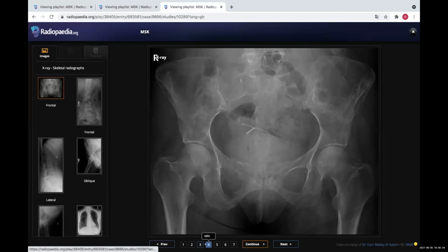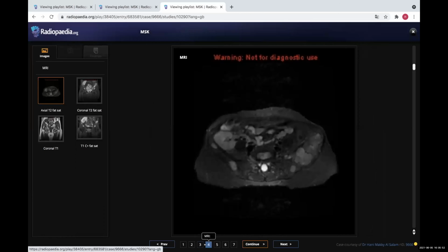I can appreciate a single surgical clip on the right lower abdomen overlying the sacrum. Is it a renal transplant? Perfect. Lovely. If you want, I can give you some MR pictures just to use the time perfectly.